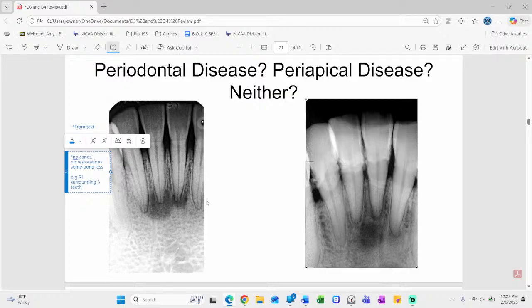Yes, sir. Is there a, say it again, is there a display? Ooh, dysplasia. Yes. Got to think outside the box. Periapical cemental dysplasia, or you'll see PCOD, so the periapical cemental osseous dysplasia, around 3 root apices.